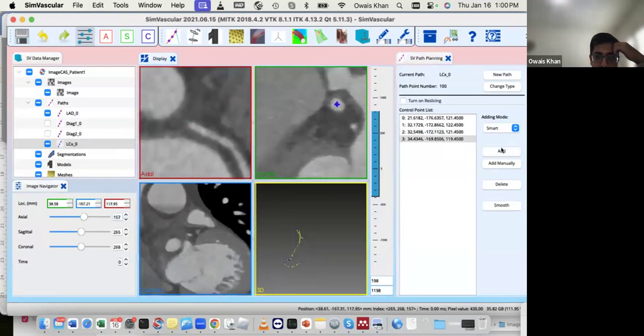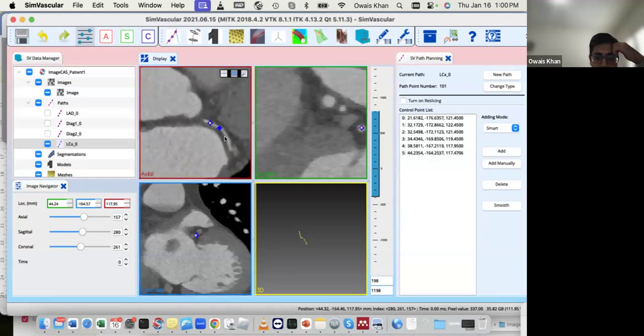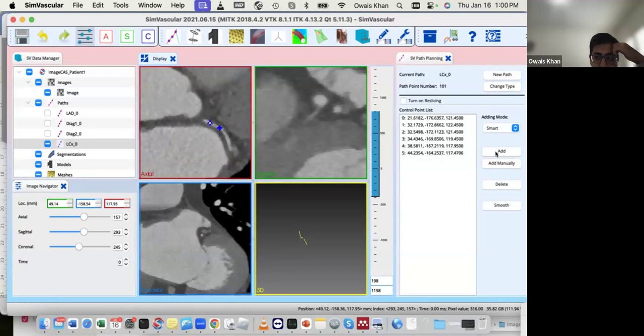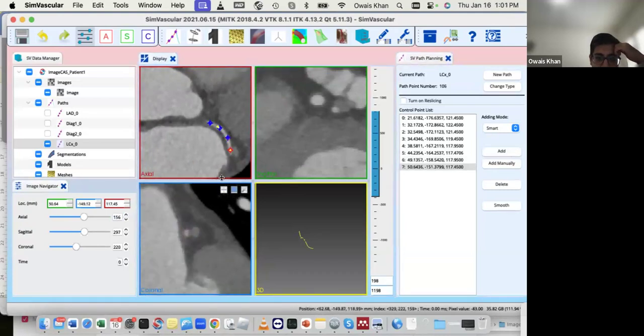Keep going. Turn this off. And keep this in the center as much as I can. LCX. Oh, you can already see how fun this is, right? That's why Anna loves doing these.